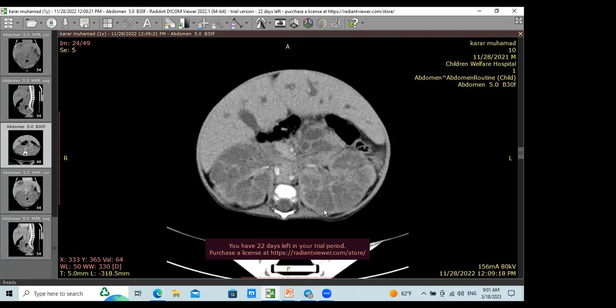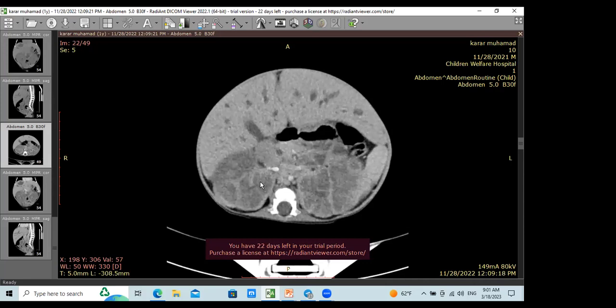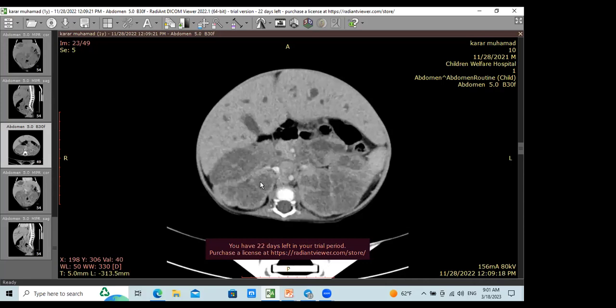Doctor Turath Jassim. Good morning. What is your opinion, Turath? As Dr. Al-Sabri said, there are bilaterally large kidneys with a hugely dilated and large liver, and a dilated intrahepatic biliary tree with cystic dilatation of the intrahepatic ducts. Some of these cysts explain the central dot sign, which goes with Caroli disease, and there is an association.